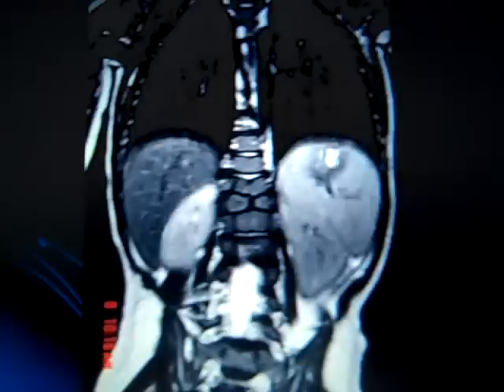And on this film, now what's in the way right here is the aorta, and so you want to mentally get rid of that. And when you do, you see there is the triangular piece right here and the triangular piece right here. And so see the end plate of the segment above coming down? That is your butterfly vertebra. This is your butterfly vertebra on this film.